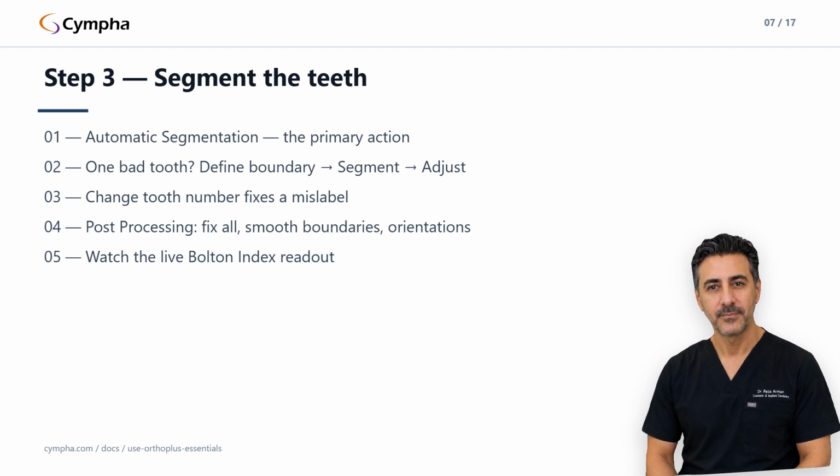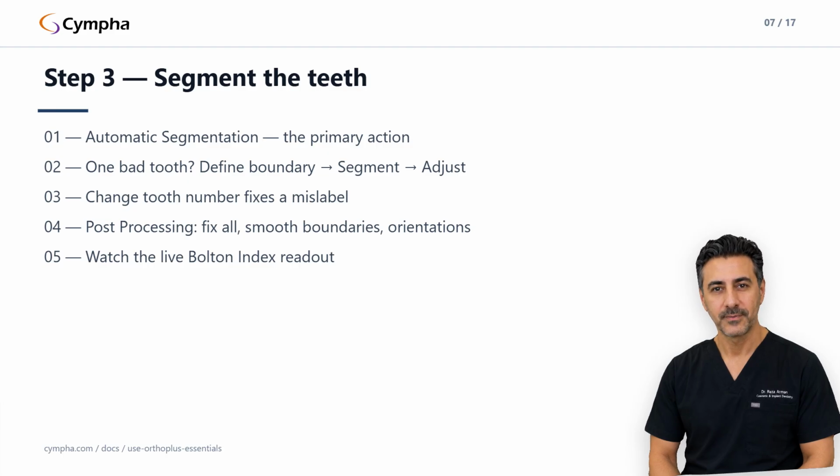While you work, the page shows a live Bolton index readout, an early sanity check on tooth size discrepancy. Why the extra minute here? Everything downstream, setup, staging, attachments, IPR, operates on these individually addressed teeth. Garbage segmentation cascades into a garbage plan.